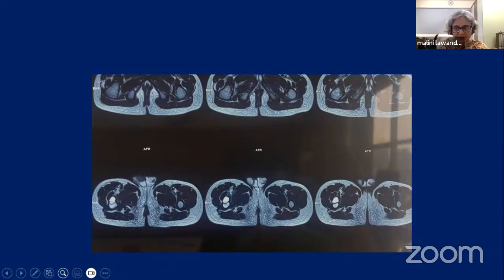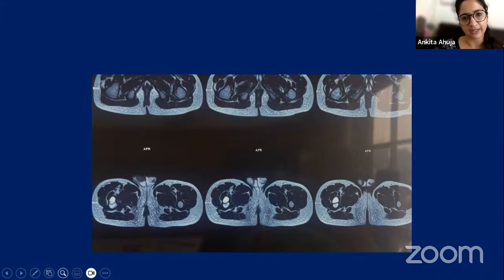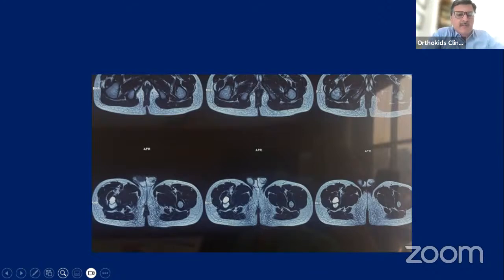Was something else established for the limp? No, I think with this lesion, whenever patients have pain around the thigh, it can be referred to the upper thigh, lower thigh, knee, or proximal leg also. And he had some symptoms, the effusion, and some limitation of terminal motion because of this. So the pain is because of this only. It's not because of some other problem like viral. Because this is exactly at the insertion of the iliopsoas. So there is the lesser trochanteric lesion. Yeah, the trochanter has expanded. And before coming to us, the patient had already received anti-inflammatories for 2-3 weeks, and still the pain was there. So it was not inflammatory pain.